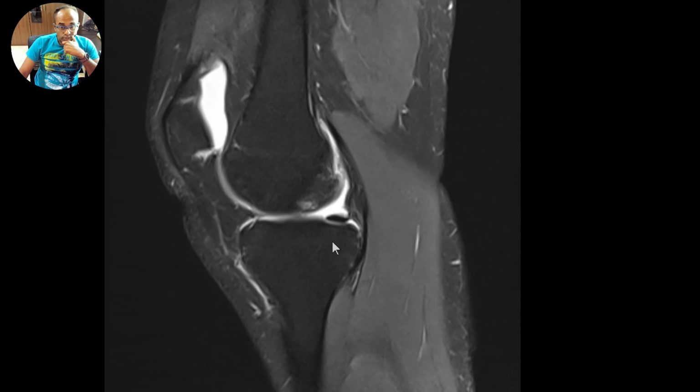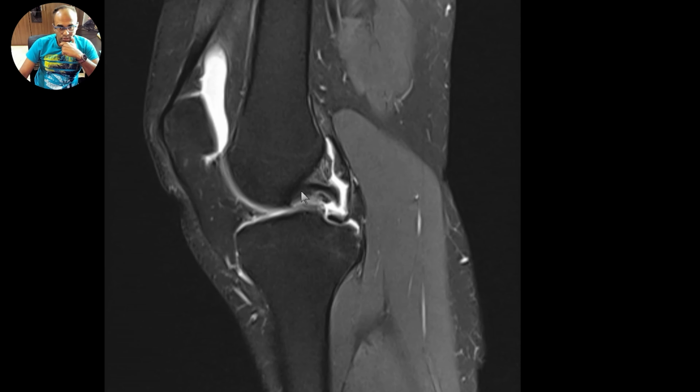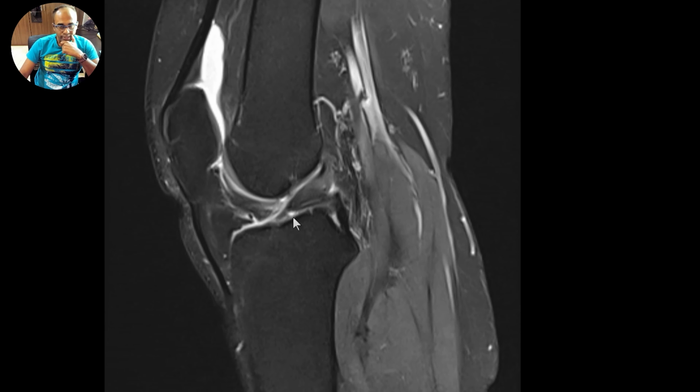Now, as we go further into the joint, I can see there's a nice posterior cruciate ligament which appears T2 dark and well intact. The alignment of the ACL appears intact, the posterior intercondylar surface of the femur, the Blumensaat line, the Blumensaat angle, everything is within normal limits. A little bit of intermediate signal is seen within the mid substance of the ACL, which is all right. It appears to be intact without any tear.